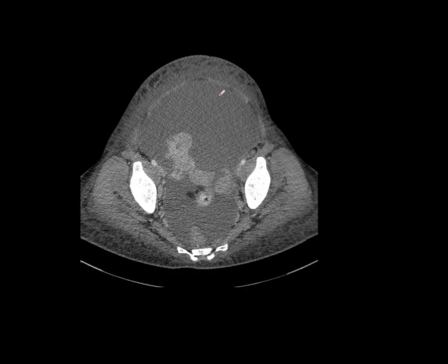So when you come across this patient, if you're asked to drain their ascites, don't just drain the ascites, don't just put a drain in here and relieve their symptoms. You've got to do the whole job and get a piece of tissue. Now you should be able to get that with ultrasound. But what will happen is, as soon as you drain the ascites, all this will collapse away, and this ovarian mass here, or the omental tumour, will fall backwards on the bowel, and it might be very difficult for you to obtain the tissue sample.